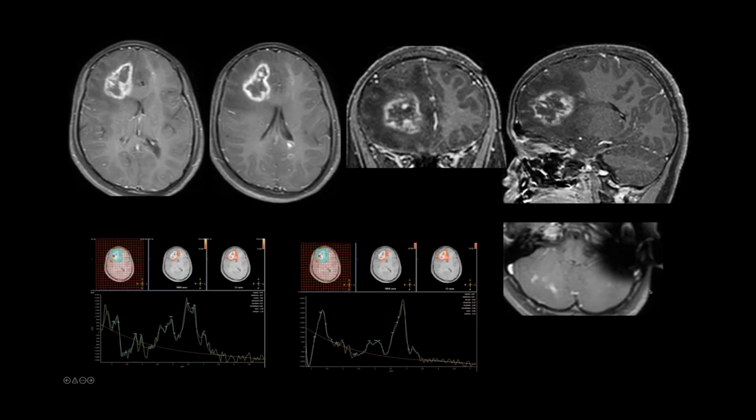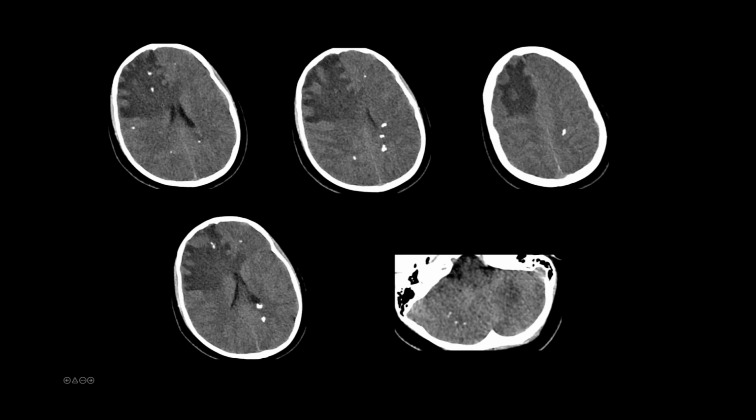I think I'll probably go to the CT first. On the non-contrast CTs, we have multiple small areas of calcification which correspond with the low signals on the GRE. They can also be seen in the right cerebellar hemisphere.